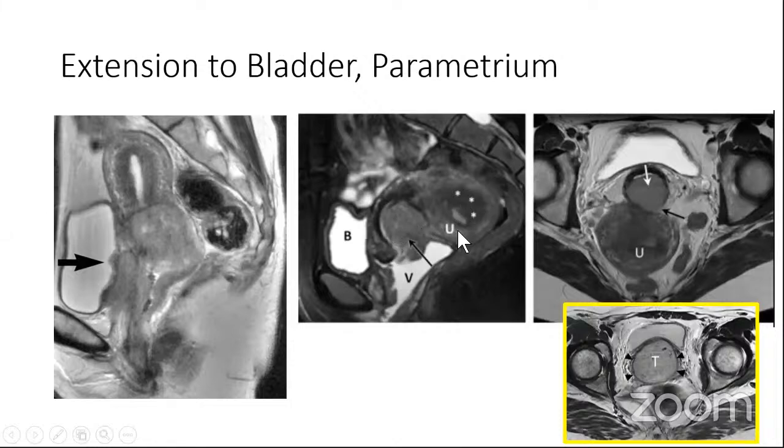So the cut section of which looks like this. Of course, typically you wouldn't expect a big mass behind the cervical mass. If there is a big mass, anything that is dark behind a cervical mass, we would all immediately attribute it to the rectum, that's a common attribution. But in this case, there's no lumen obviously in this dark shadow. So this is nothing but the cut part of the uterus at this level.